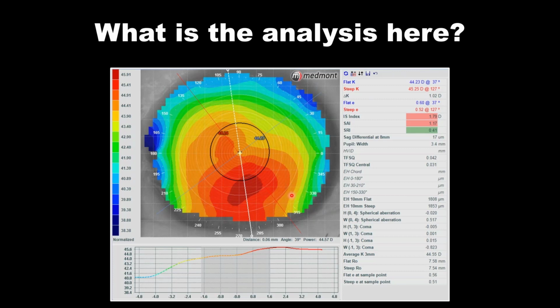Of course, what is the quality of vision? What are the slit lamp signs for this patient? But you get some sense of how we might use topography. Here we can't definitively say that this is an irregular cornea. We can certainly say it's a droopy corneal apex, and we can say that some of the disease detection indices are suggesting possibly a diseased eye.